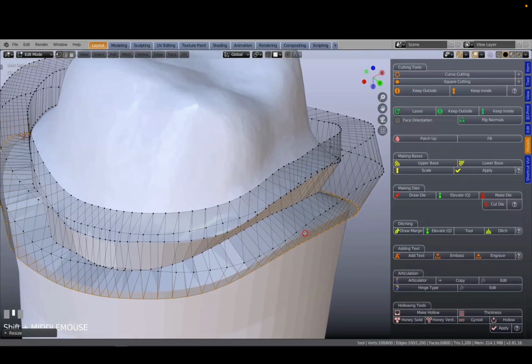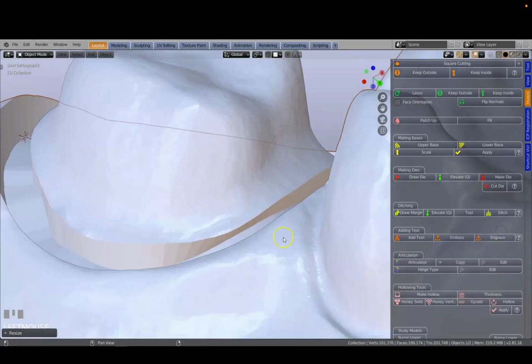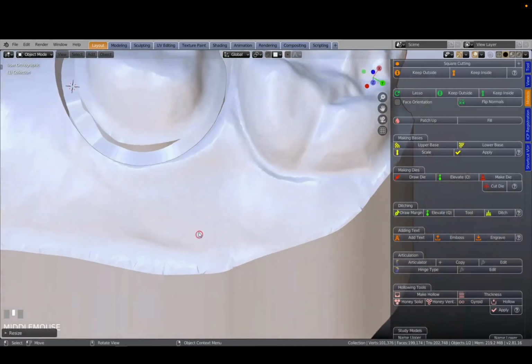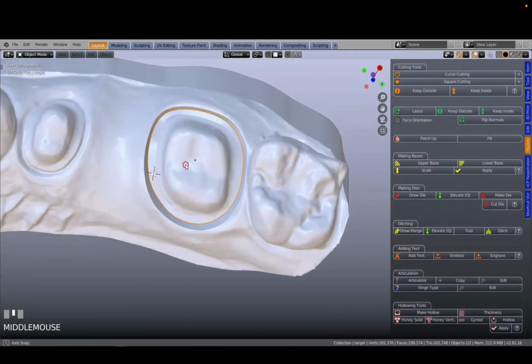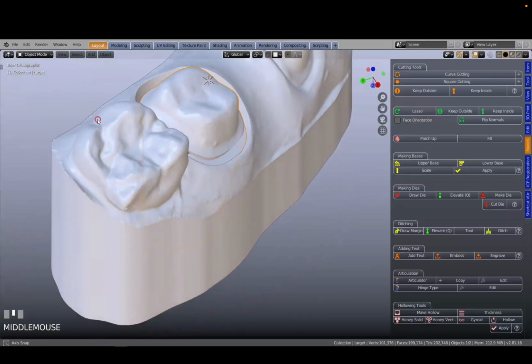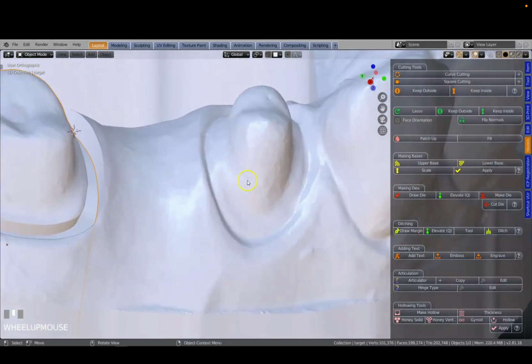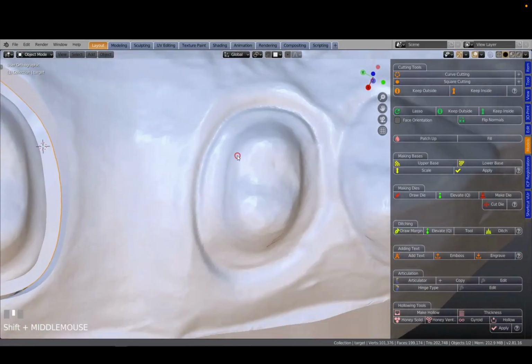When you are satisfied with the outcome, move back to the menu and press the Ditch tab. This has trimmed the tooth margin in an example with a full-bodied die. Next, we will briefly demonstrate how to use the ditching tool without making a removable die. In other words, we are only ditching the margin of the tooth preparation and removing some of the surrounding gum. The tooth is not separated from the model.